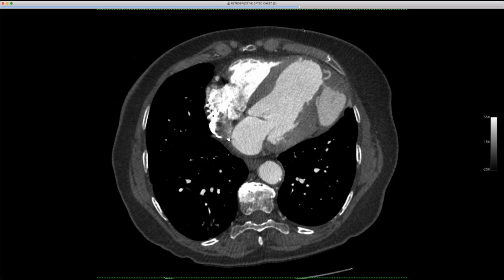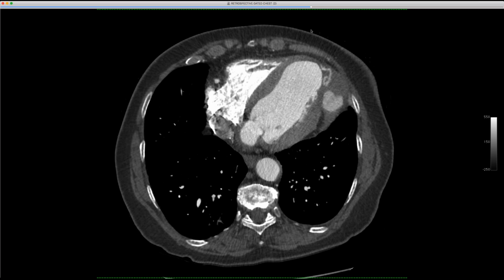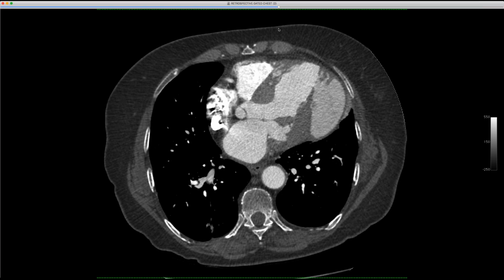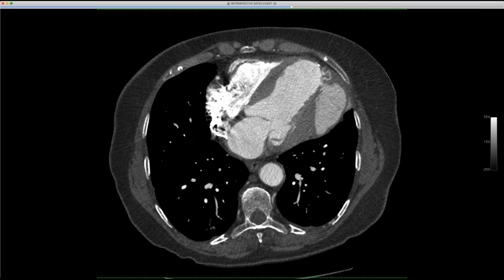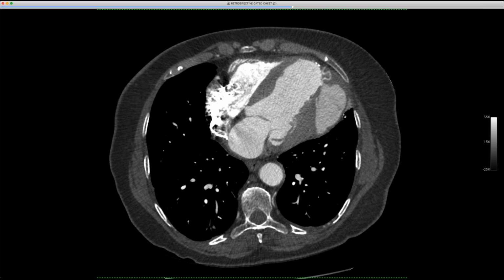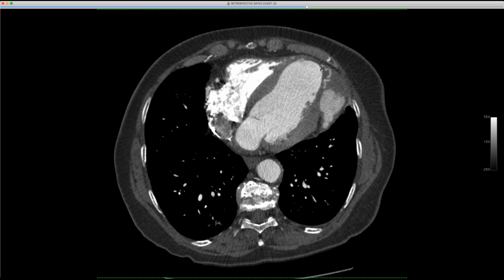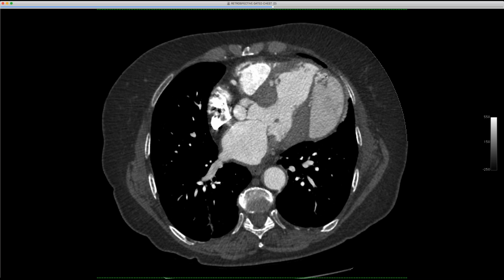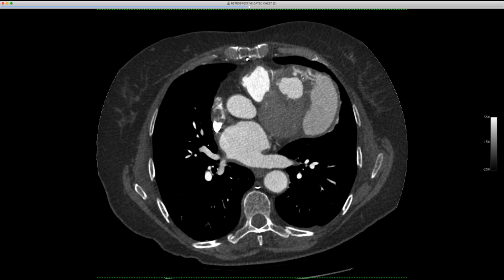I don't remember the underlying abnormality. I think there was a VSD that was closed, and there wasn't quite enough. The repair wasn't quite ideal from lack of myocardium. So I don't know if this is just related to injury from that, or if there's some underlying myocardial deficit or defect. But this is quite a large one down here. And what was odd to me was this contrast tracking into the myocardium itself, up along the anterolateral wall and towards the top here.